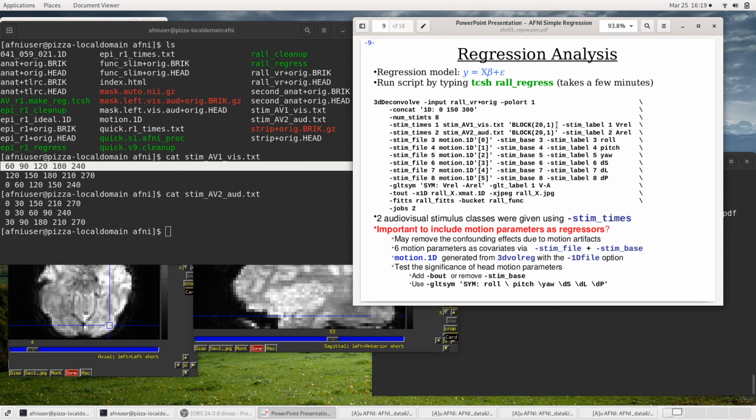Remember, in this example, each event is a 20-second event where there's a repetition of someone saying simple words and showing you both the visual of that, and you hear the auditory of it. But it lasts for, say, 19 or say 20 seconds.